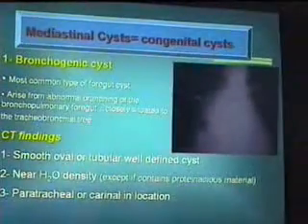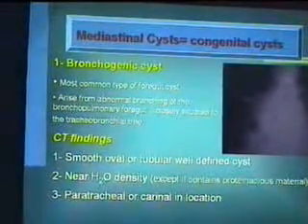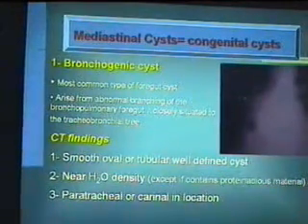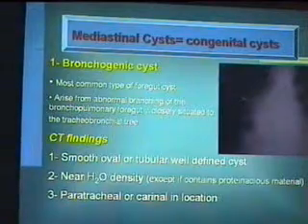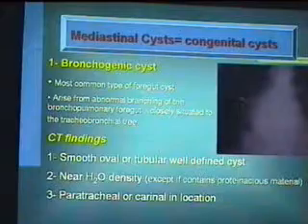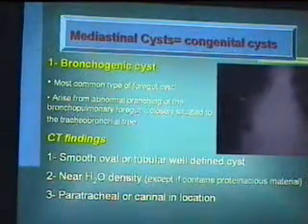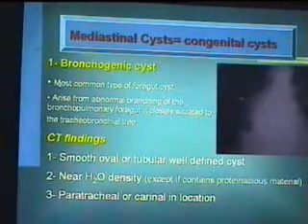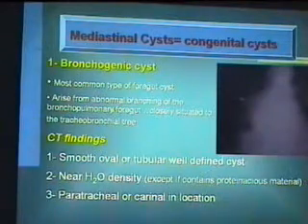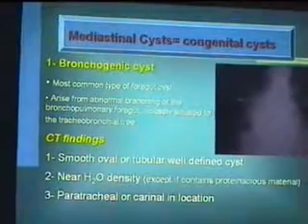We come to the mediastinal cysts, and we agreed that mediastinal cysts are congenital cysts. The most famous is the bronchogenic cyst. From its name, where will it most likely be? Bronchogenic, likely in the middle mediastinum. Exactly. Remember the lateral picture where we said that at the tracheal bifurcation we find a few things. The bronchogenic cyst is the most common type of foregut cyst, arising from abnormal branching of the bronchopulmonary foregut, closely situated to the tracheobronchial tree.